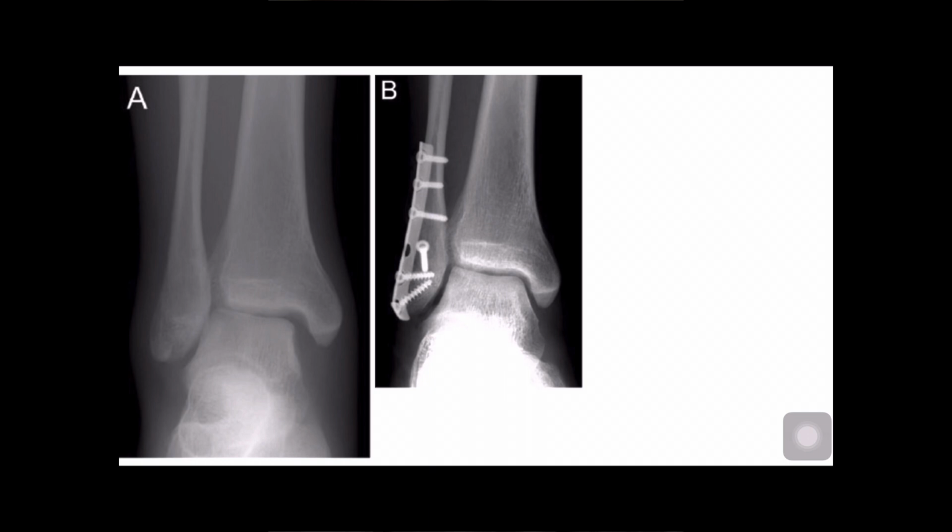You cannot assess properly, so we can say that that's a subjective finding. He looked at the X-ray and found a good reduction. The syndesmosis looks good. The medial clear space is equal to the tibiotalar space, so it looks good.